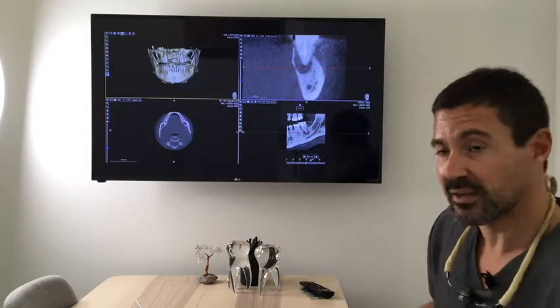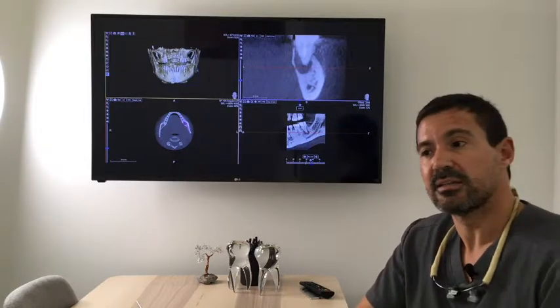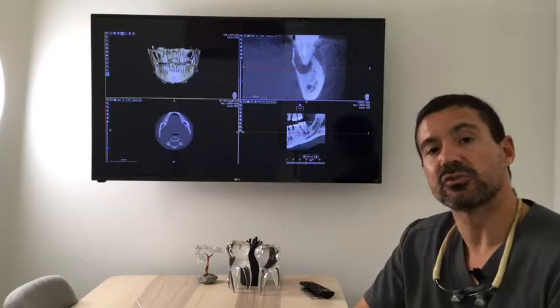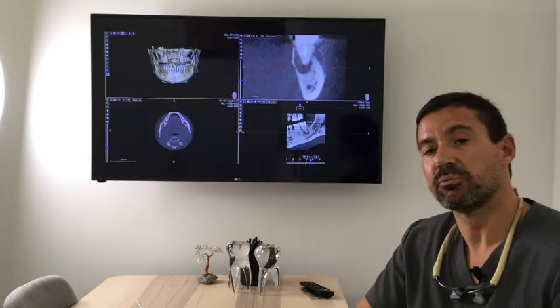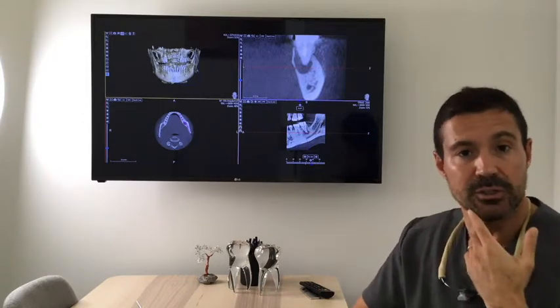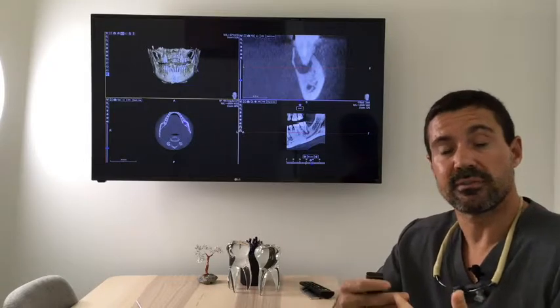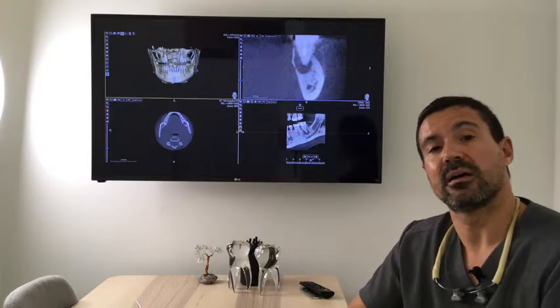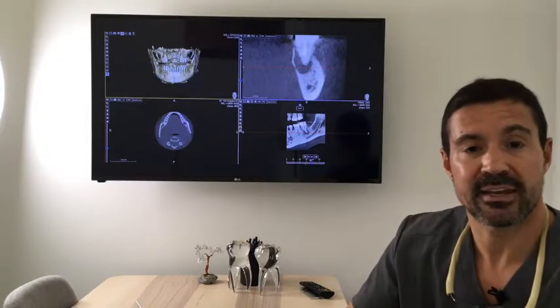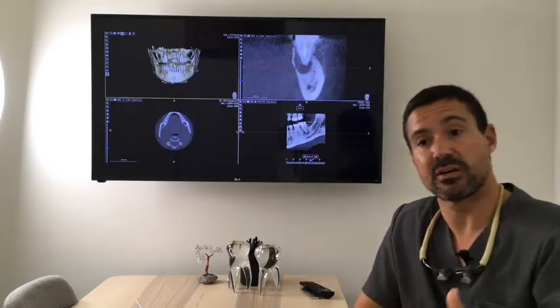Also, one of the things that we are actually going to see is the integrity of the lingual plate, which I consider very important, and not many people are mentioning it. The lingual plate is very, very important. Whenever we are extracting a tooth, we must be careful not to break that lingual plate, because sometimes when we break it, we end up with very sharp edges, and if those sharp edges are really deep, they may affect the lingual nerve. Why? Because the lingual nerve goes really deep at the bottom area of the mandible, and if you create a bone fracture of that lingual plate, you can create very thin edges of that fracture that might face that lingual nerve and develop a lot of problems in terms of paresthesia, and the patient may refer some paresthesia on the tongue.